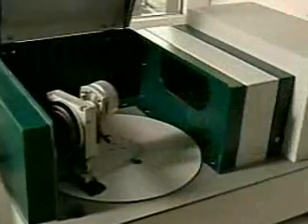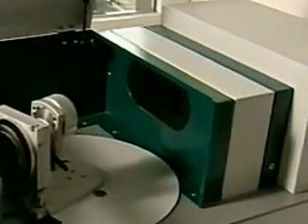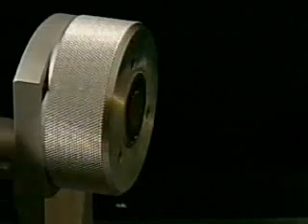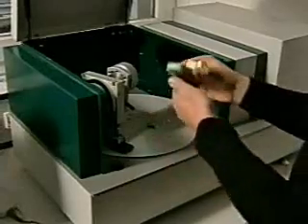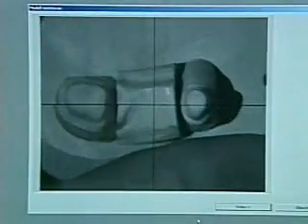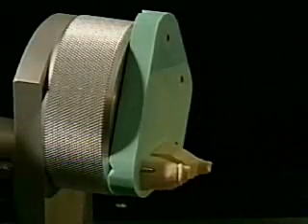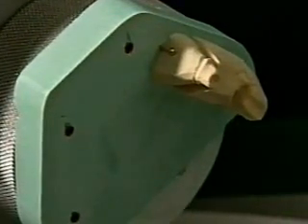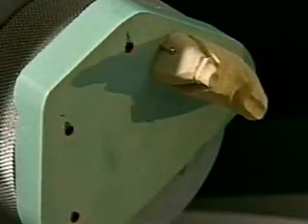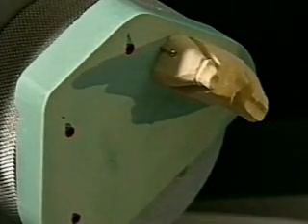Manufacturing the frame begins with non-contact photo-optical scanning of the model with the lava scan. In this, the cores and region of the connecting part are scanned several times from different sides. The scans of different model positions are the basis for calculating the three-dimensional image data. Changing the model into the various positions should not be observed under normal circumstances because the device must then be closed.